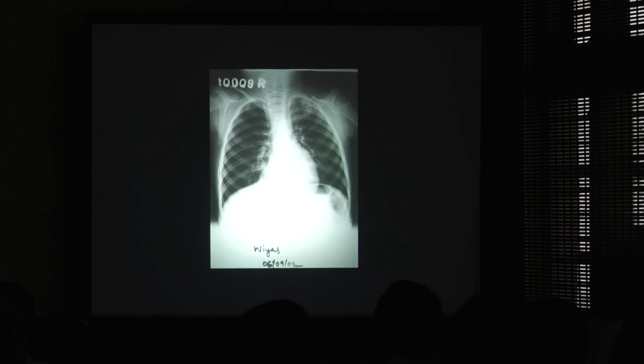Just look at the bony structures. Very good, very good. Yeah, it's extremely good. That means she has followed whatever I have said. See, the left clavicle is not seen here.